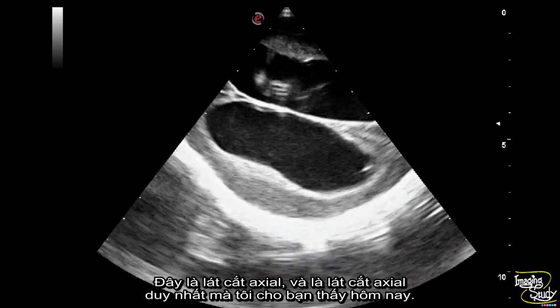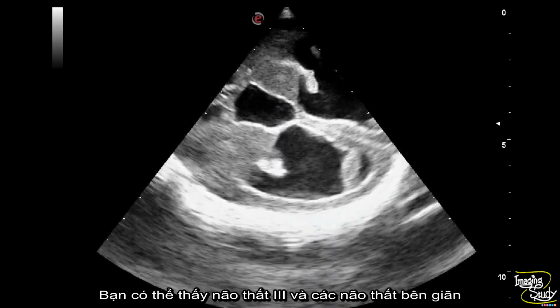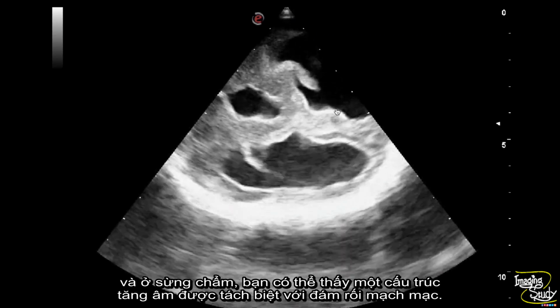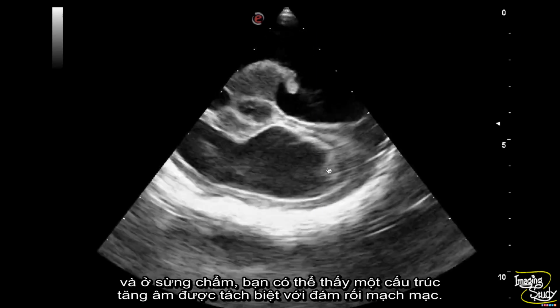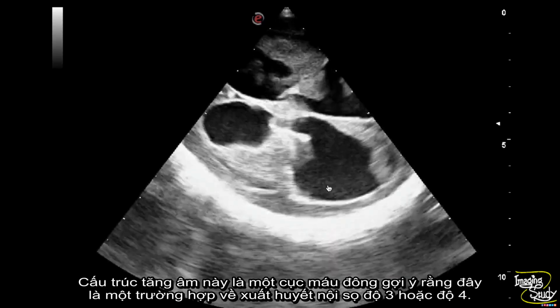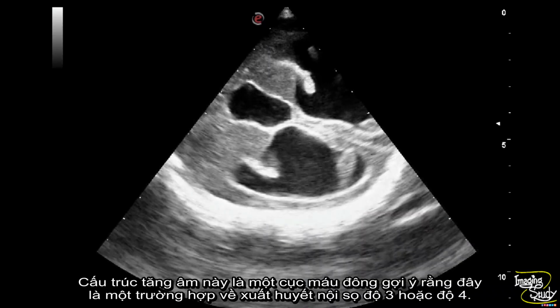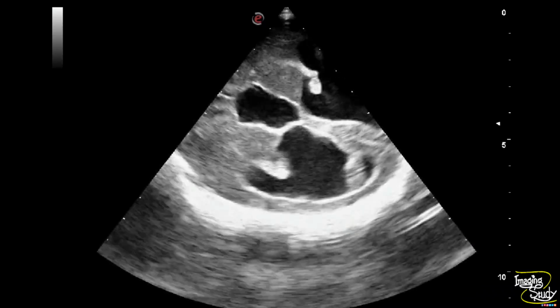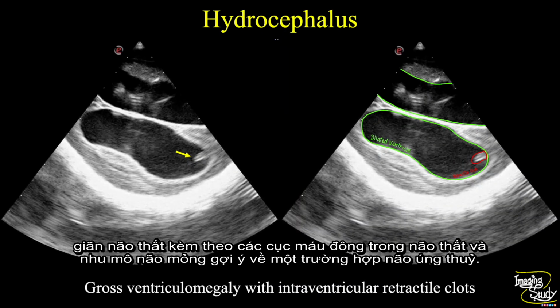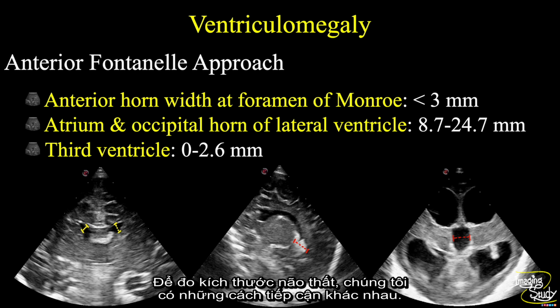Here is the axial section, the only axial section I have shown you today. You can see the third ventricle and lateral ventricles are dilated, and on the occipital horn you can see an echogenic focus separated from the choroid plexus. This echogenic focus is nothing but a retractile clot, indicating it to be a sequela of grade 3 or grade 4 intracranial hemorrhage. Here's the picture. You can see there is gross ventriculomegaly with intraventricular retractile clots and thin brain parenchyma, indicating a case of hydrocephalus.